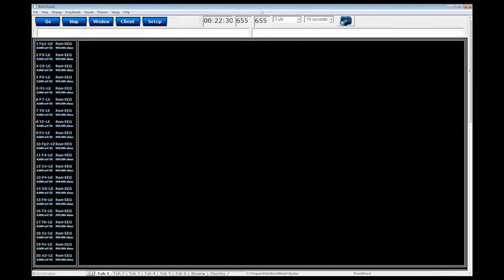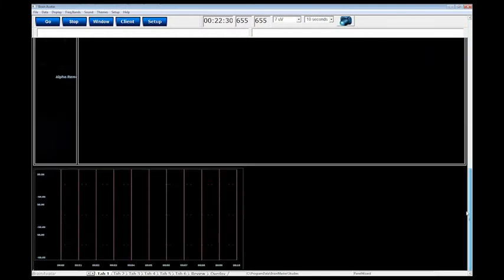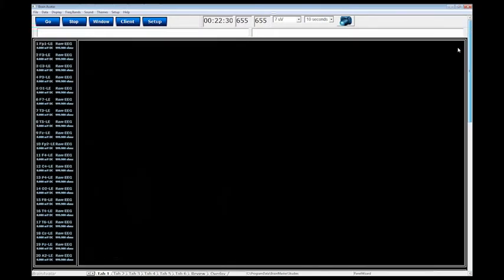It's going to just basically take all 3 displays, or all 4 displays, or all 5 displays, and it's just going to stack them on top of each other, and it's going to have the defaults built to exactly what they are. Now, that's one of the things that we can change in the new software.